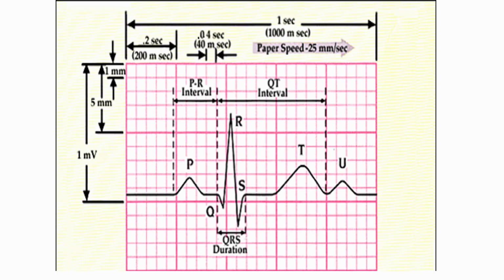Here's what a typical ECG beat would look like on paper. Conveniently, the wave starts right on a box, so we don't have to start counting in the middle of boxes. Check out the box layout. We have tiny boxes, which are 40 milliseconds, grouped into 5 tiny boxes, representing 200 milliseconds, and then we're looking at 5 big horizontal boxes from left to right, which represents a second.